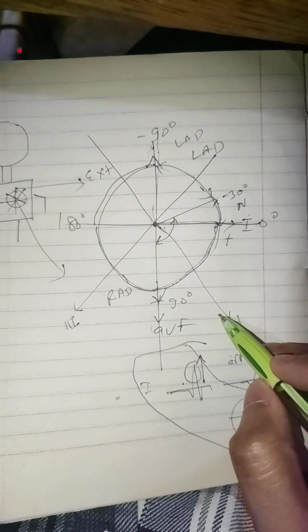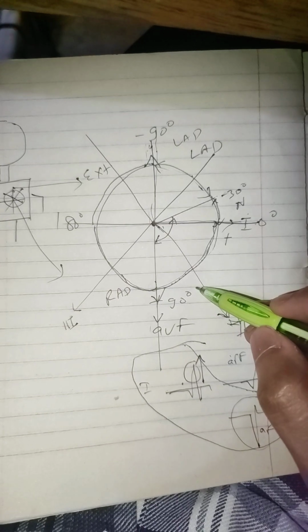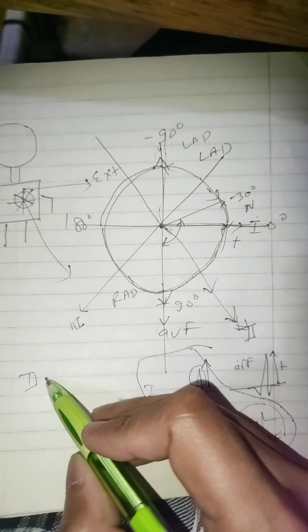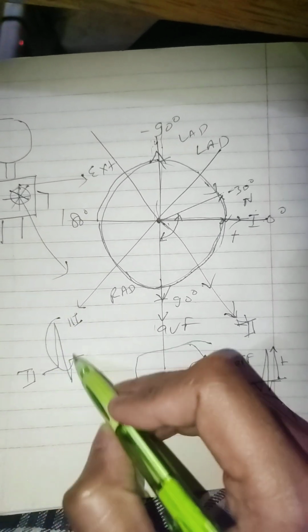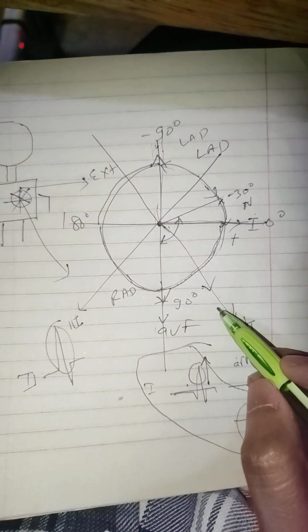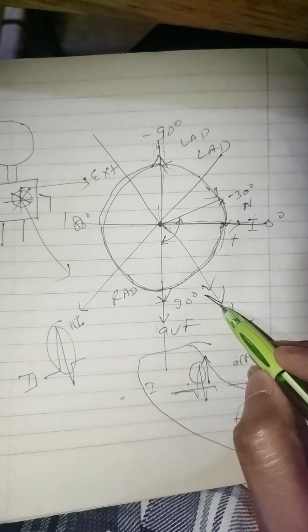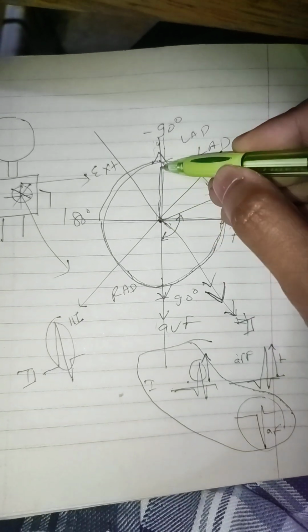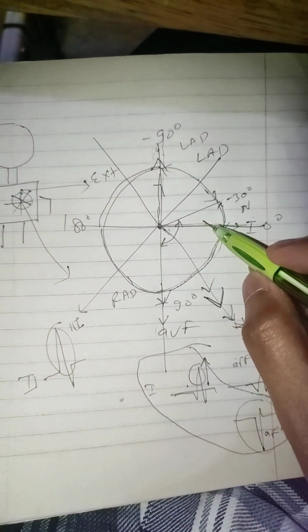So this is lead 2. In lead 2, let's say it is positive. In the ECG lead you checked and you found it like this, let's say. So predominantly positive deflection. It means the net vector is in this direction. So the net vector is in this direction, AVF is in this direction, and lead 1 is in the positive direction, right?